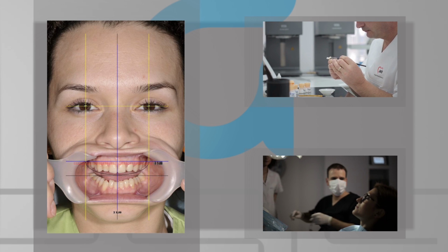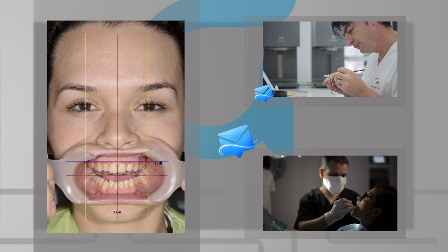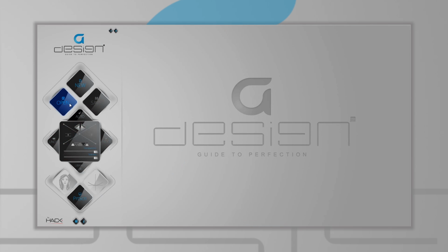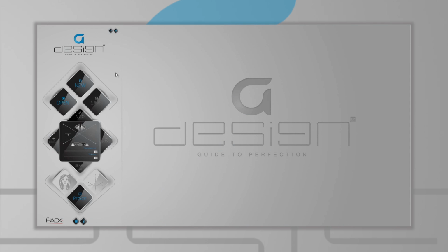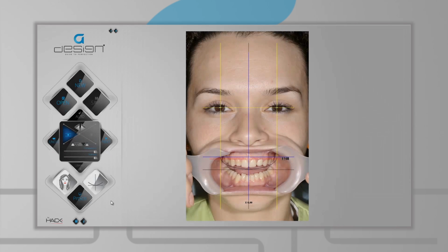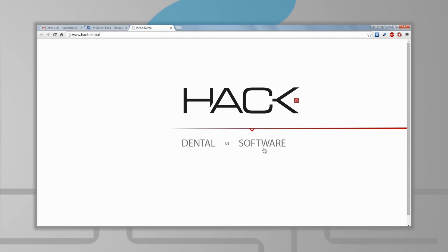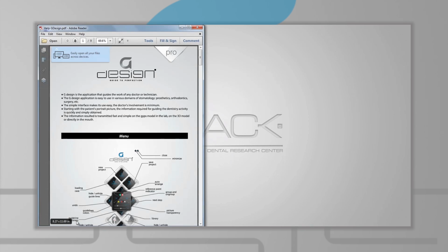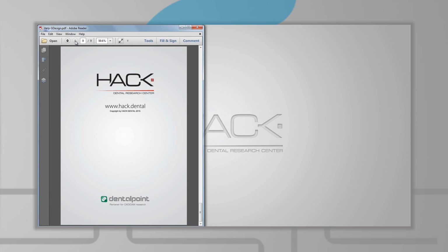The image can be sent via email or any other method to the laboratory or to fellow dentists. Press Save and choose the target directory to save your project. By pressing Open, you can open one of your previous projects. Press Info for more information. An ample guide for using this software can be found in the document named Help in your G-Design pack.